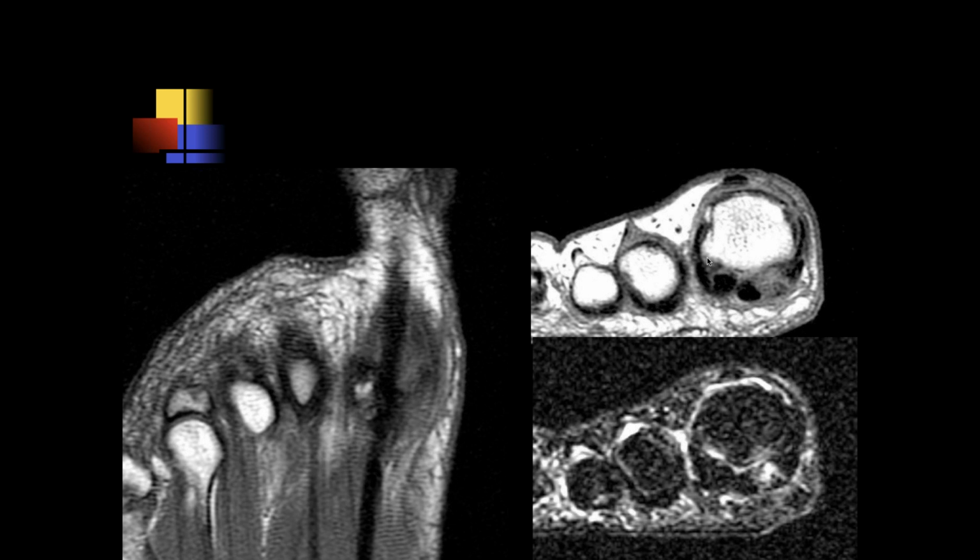Okay, so here it looks like we're looking at the great toe MTP joint, and there's some decreased T1 signal and edema within the tibial great toe sesamoid. This could be seen with avascular necrosis or sesamoiditis. Yeah, when you get edema in the sesamoids here, I don't like to use the term sesamoiditis. Isn't the medial sesamoid subluxed laterally? Yeah, I don't know. Maybe a little bit.